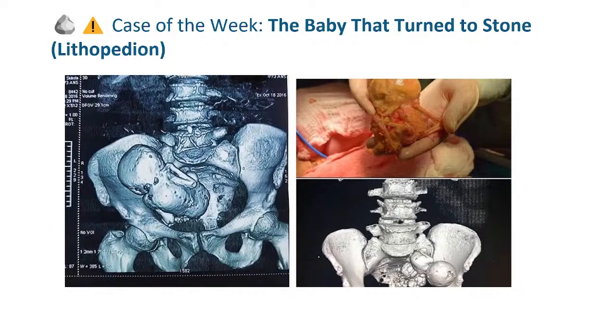We will review the patient's clinical history, analyze the ultrasound findings in detail, compare them with X-ray, CT, and MRI appearances, discuss the differential diagnosis, explain how the diagnosis was reached, and finish with the key learning points that every ultrasound professional should know. I also have a challenge for you before I reveal the final diagnosis. I want you to carefully study the images and tell me in the comments what you think this lesion is. Could you diagnose this rare condition before seeing the CT scan?